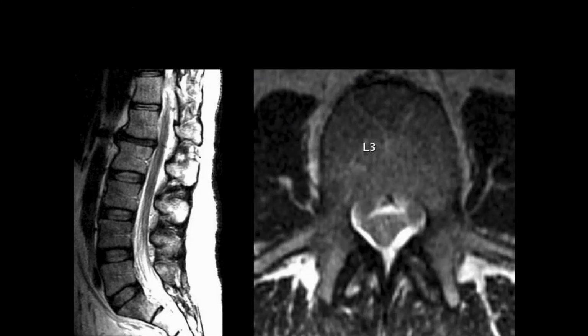So we're looking at L3 on the axial. So I think looking in the spinal canal, yeah, we should see some cauda equina there, but they look kind of bunched up. So this is a low-lying conus, and you look to see if it could be a tethered cord, but sometimes it's not. It's just a low-lying conus, and that's what this was. Okay.